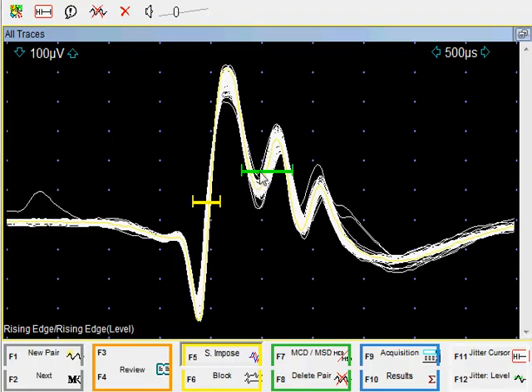But if you feel more comfortable, you can change the position of the window. You can bring it like this. Once again, notice that I'm putting it roughly between the peaks. This is where the signal is at its sharpest. It's not necessary, but if you feel compulsive, you can also adjust the duration. So right now I'm analyzing the time interval between the first potential and the second potential.